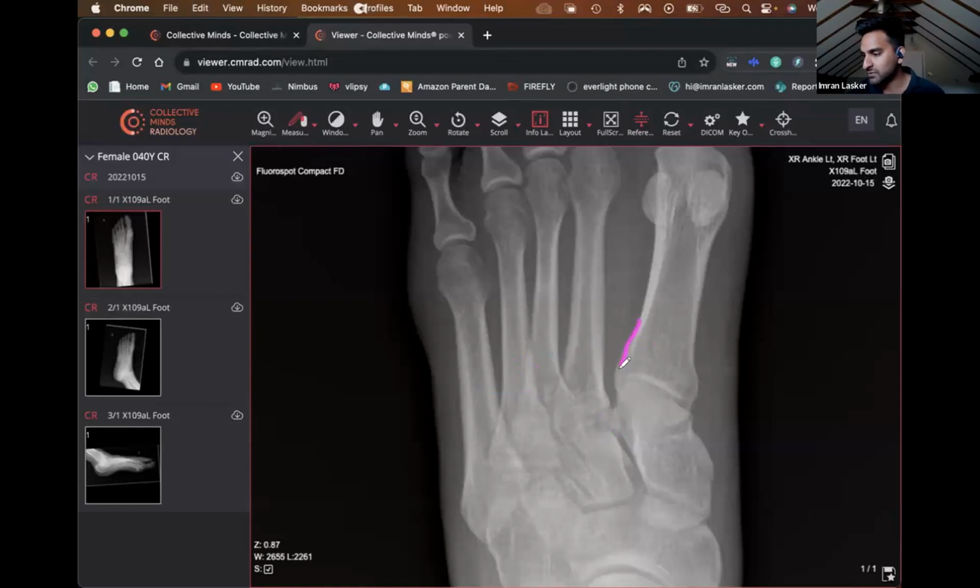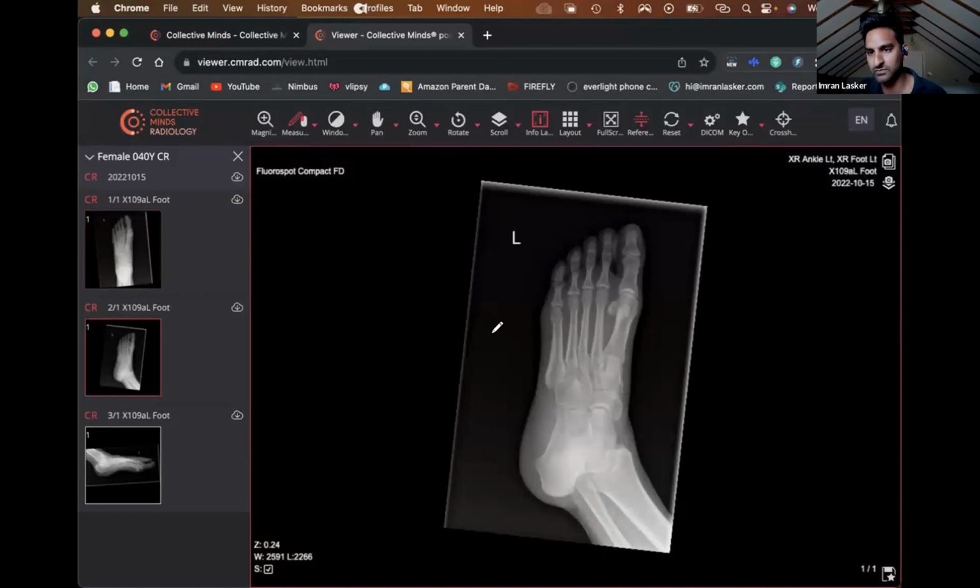But when you look at this, let's draw this out. That looks okay. Coming up to here, there's a linear line there and a linear line there, and then you've got more bone and you've got a whole load of overlap. But to me, that does not look right. And I would be concerned that there could be a Lisfranc ligament injury, because it's kind of pulled off from there, this could result in transference across, right?